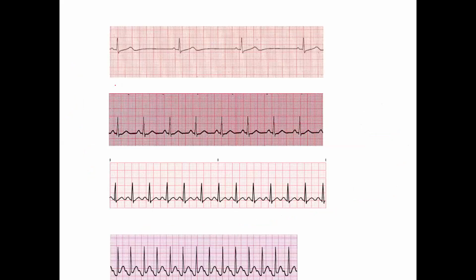So this is kind of what you'd see. And this is a very slow heart rate. I think if we did the top, like this is A, that's really slow, B, C, and D. Now these are all getting progressively faster. Look at the R wave distances. Just by looking at them, you can see that. But that's no way to evaluate. But it's pretty obvious. And they're all regular rhythms, as should all the rhythms of the students we do.